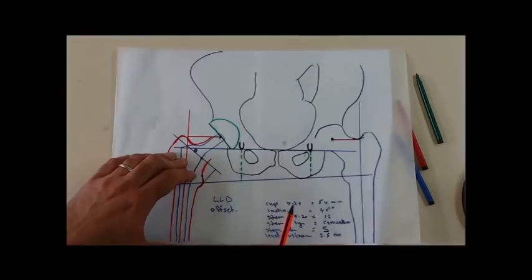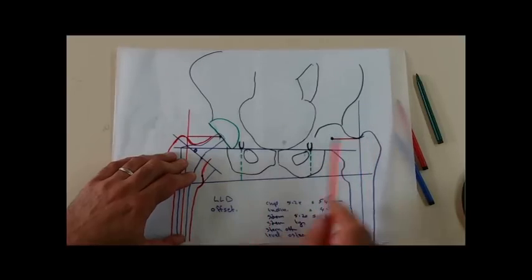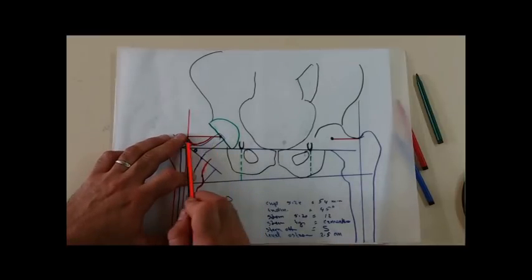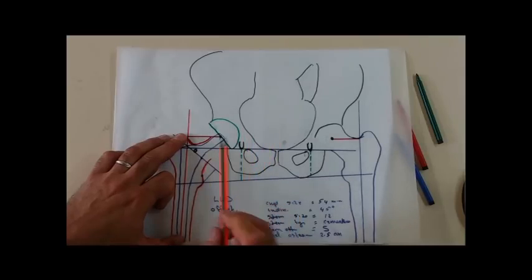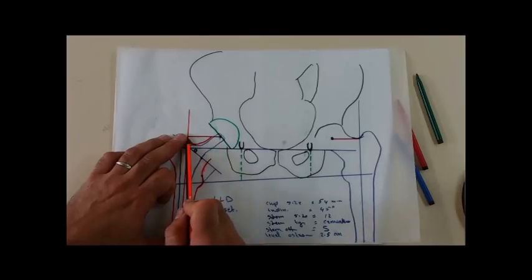The ideal one is to have symmetrical femoral offset here and there. This is the normal one, 4 cm. I should have the same femoral offset in the replaced part. How will I decrease this offset? There are many solutions for that. For example, in this cementless stem and in this sample, I have got lengthening of the limb as well as increasing the offset.